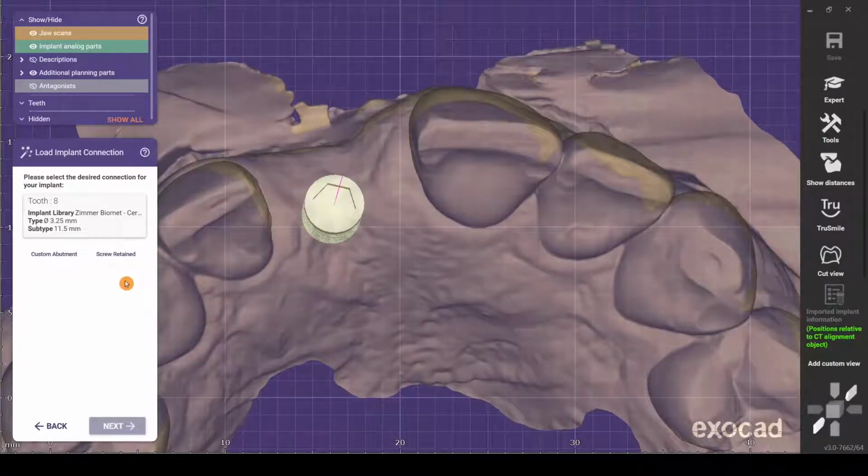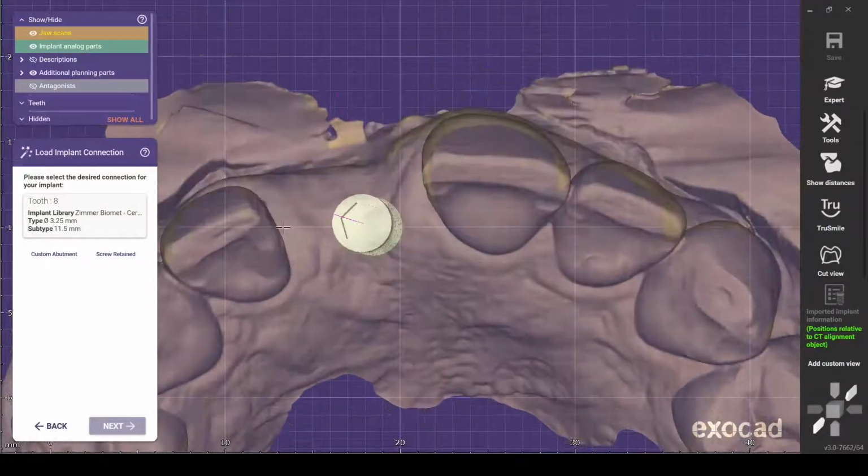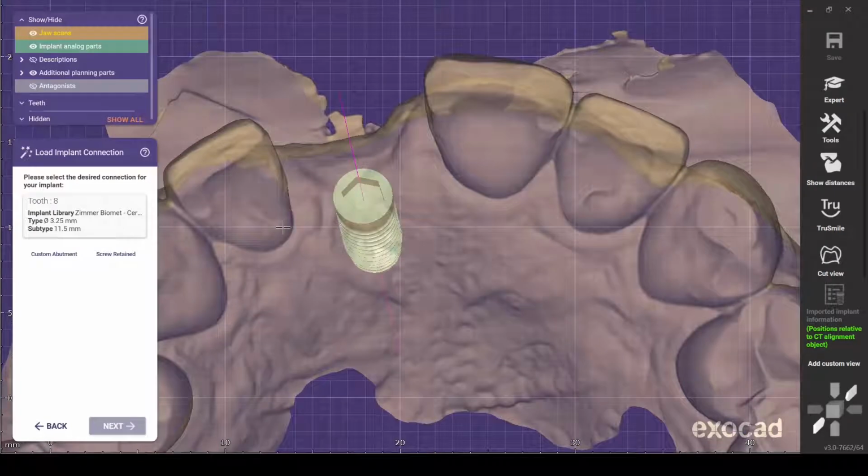One thing to think about is how are we going to manufacture this? If we're going to be making an immediate provisional, if we're making it out of all acrylic or printing crown and bridge resin, it's risky to do that with just acrylic. In other words, no tie base. So we have sort of two options here. I'm almost always going to select screw retained for a temporary or a provisional. And we could do it on a tie base, or we could do it direct to implant.